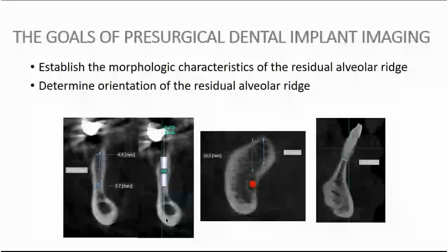Also, we need to make measurements, and these are examples of some situations that could influence our treatment more or less, and it could make a difference when we are trying to do the follow-ups on 2D X-ray technology, that maybe we didn't use the whole potential of the bone, but actually CBCT is giving accurate data for us, and we are really able to understand this.